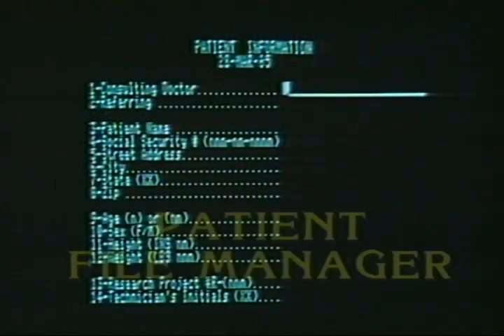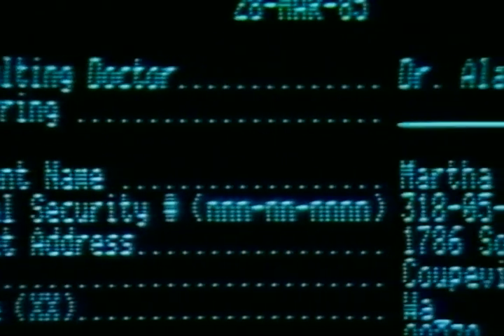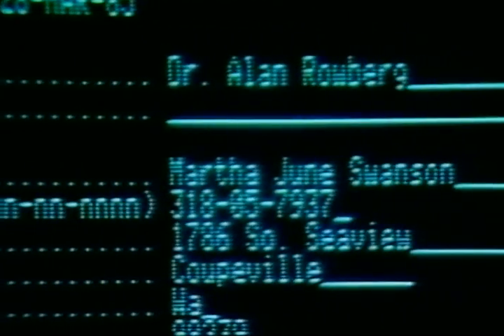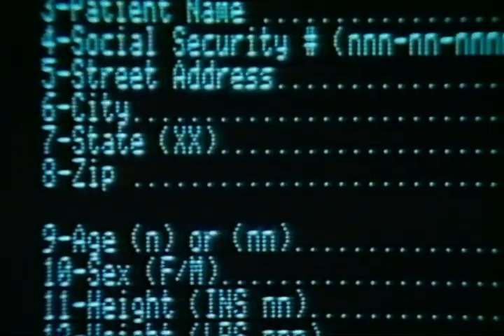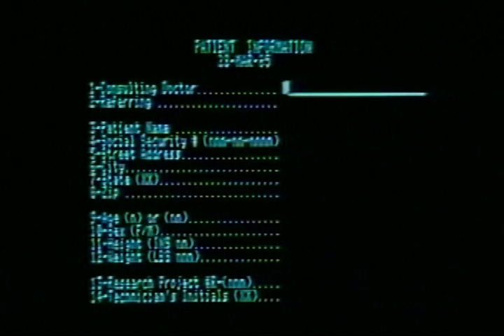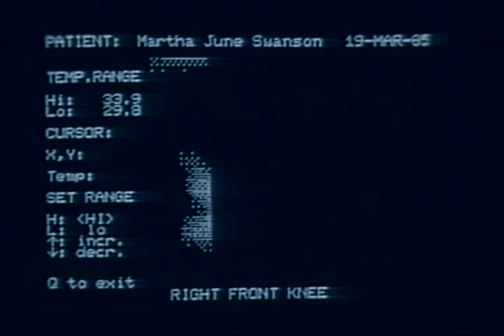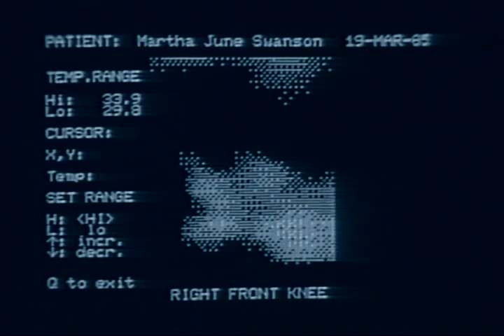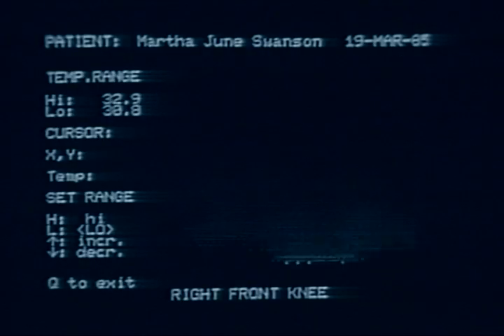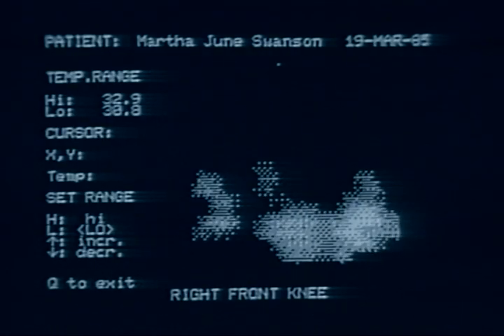The GST Patient File Manager, which is resident on each magnetic patient disc, stores the final patient data. Using the Patient File Manager avoids the traditional problems of setting up a camera to photograph a display screen and keeping images on self-developing film over time. The GST thermal images and individual patient data can be read on any GST Thermal Profile system and printed by the System Graphics printer at any time.